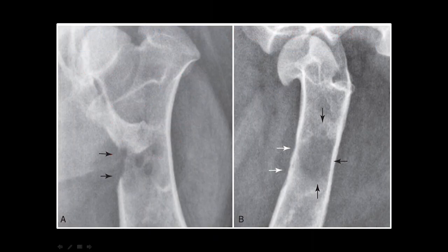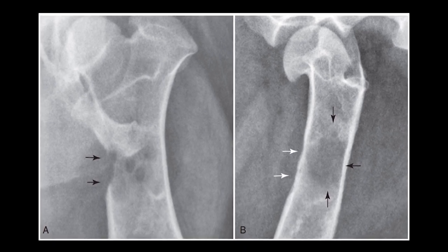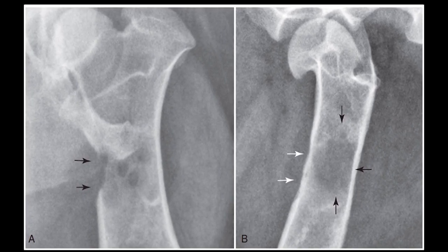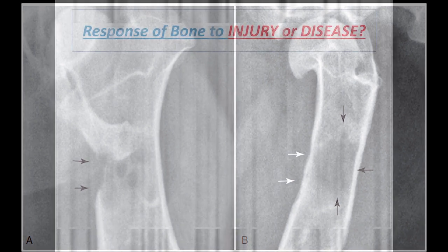Look at this radiograph. The arrows are directing towards the lytic changes on the bone, and the bone density decreases at these spots. So the radiographic shadow at these spots becomes grayish black as compared to the other bone.